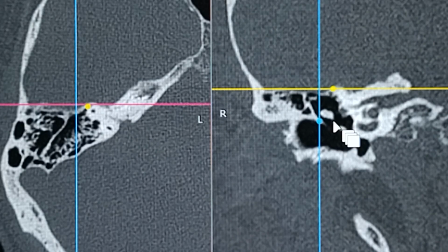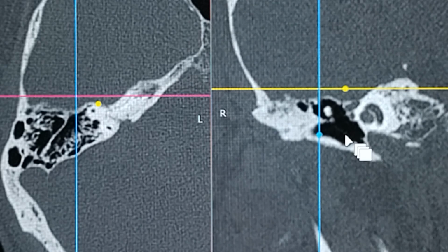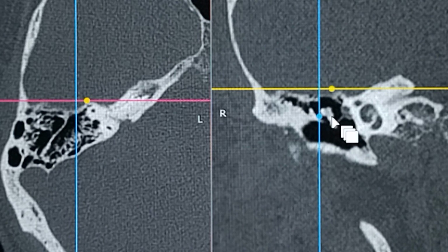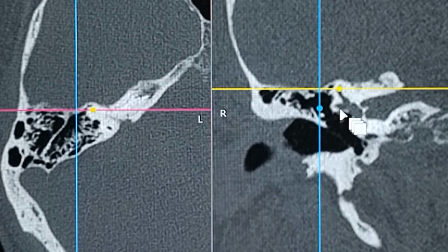So any suspicion you can see on the CT scan. You can see this is a normal lying dura. You have enough space between the ossicles. See, if I'm exposing the epitympanum right there, that's the epitympanum, you can see. That's the epitympanic area, that's the ossicle right there. You can see there's ample amount of space between the superior most surface of the ossicle and the tegmen plate. Okay, if this tegmen plate is very close to the ossicle, or you can say at the level which is just near the lateral semicircular canal, it has to be considered as a low-lying dura.